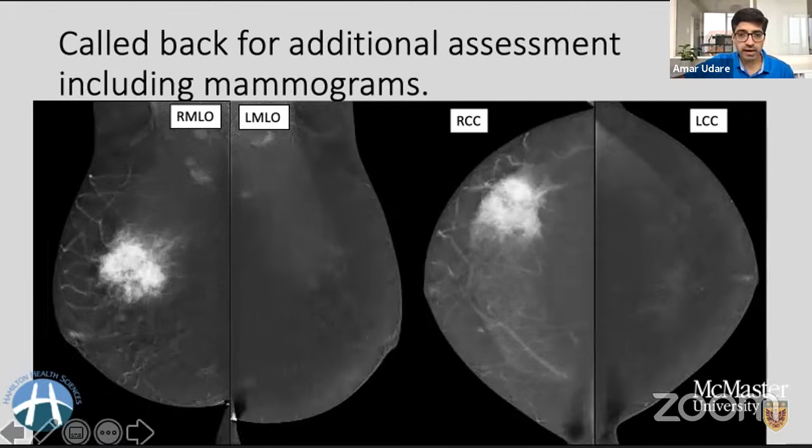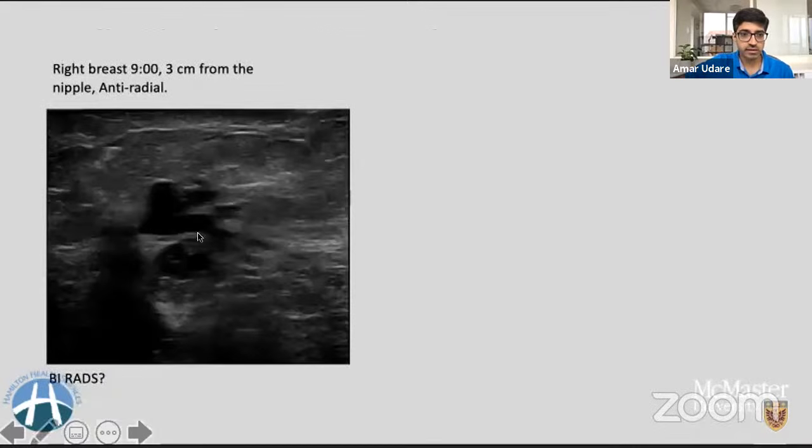So going back, how it is going to appear on some of the images is like these cystic spaces. That is what misled to assigning this patient as a category 3. But nonetheless, start with your clinical assessment. Make sure that you're offering appropriate imaging tests before offering your BI RADS category.